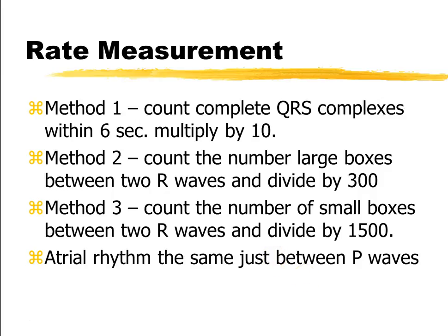Now, if you are trying to figure out the atrial rhythm and not just the ventricular rhythm, you do the same exact thing, only you look at the P waves instead of the QRS complexes.